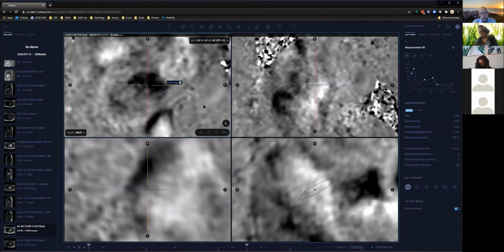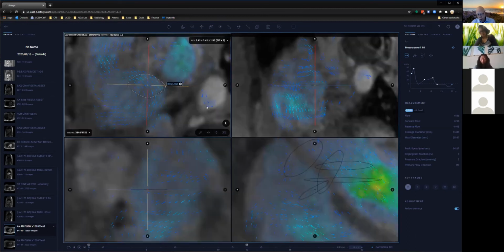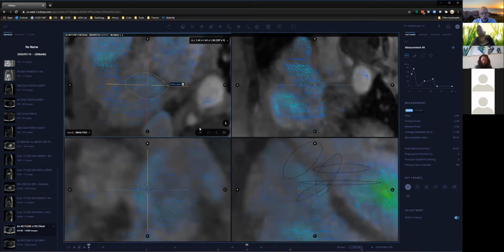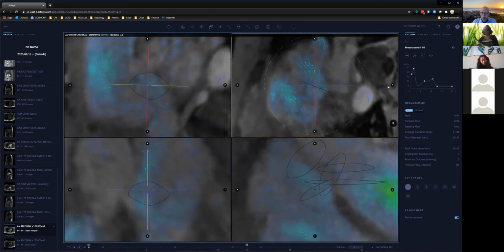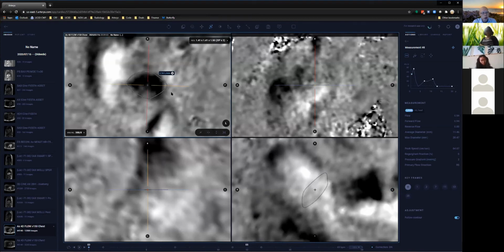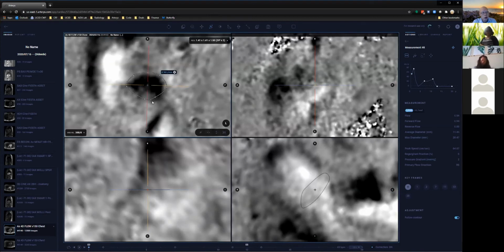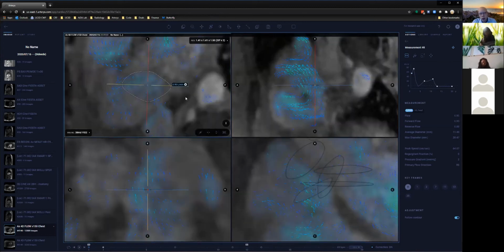The tricuspid is considerably easier than the mitral because the jets are almost always straight. They may move a little bit, but they don't usually move a lot. So that's part of the reason why I suggest first looking at the tricuspid if it's important to quantify with cardiac MRI, which it usually is. In a lot of these cases, you can kind of guess what the severity of regurgitation will be.